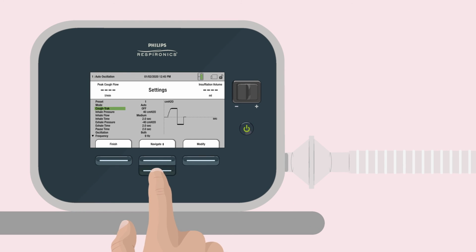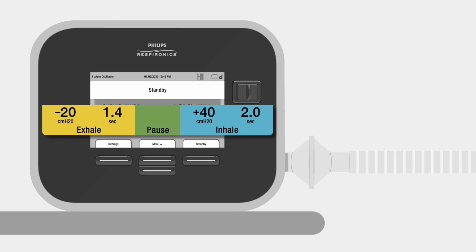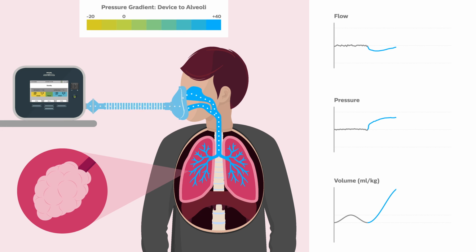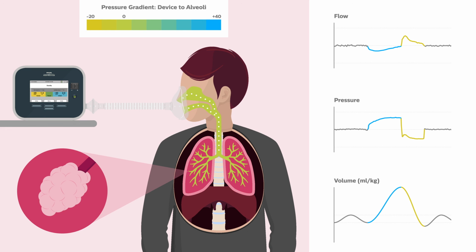In animation model 4, we're going to conclude with the same bulbar ALS patient profile. However, with this model, we're going to first reduce the magnitude of the negative pressure setting, and we're going to change the patient technique. This time, the patient will be instructed to synchronize a maximal effort open glottis huff at the start of the exsufflation phase. These changes in our model shift the zero pressure point to the left, keeping the negative pressure at the level of the mask, and our point with the model is our upper airway maintains patency throughout the exsufflation phase.